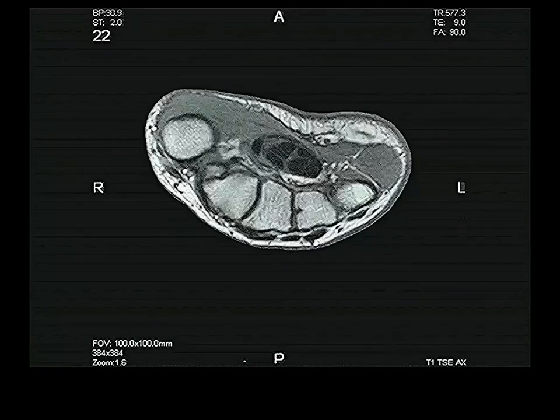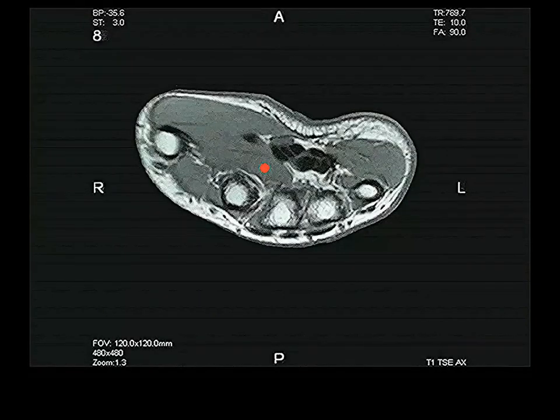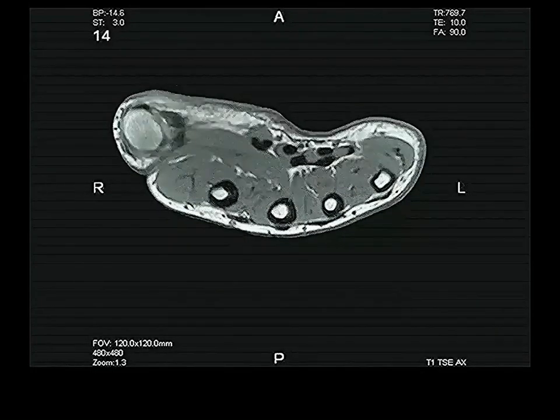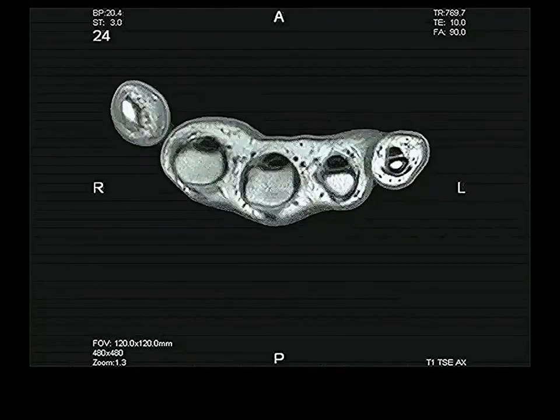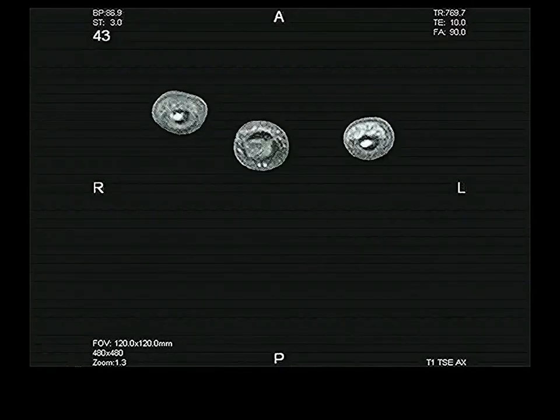There's other things you can see unlabeled here. These are all your thenar eminence muscles on this side, the hypothenar eminence muscles. Here's a beautiful adductor pollicis on this side. You can see it's like a dissection. You can see everything. These are all the dorsal interossei here, somewhere on palmar, but I don't know where. And you keep on following, you can see the independent flexor digitorum superficialis and flexor digitorum profundus tendons as they separate out. Flexor pollicis longus here, and then all the way out to the tippy tips of your fingers, and then that's it.